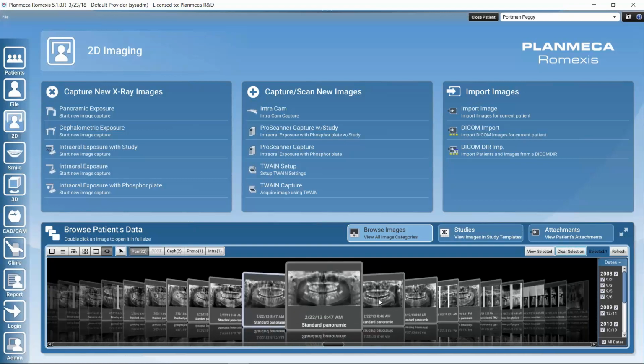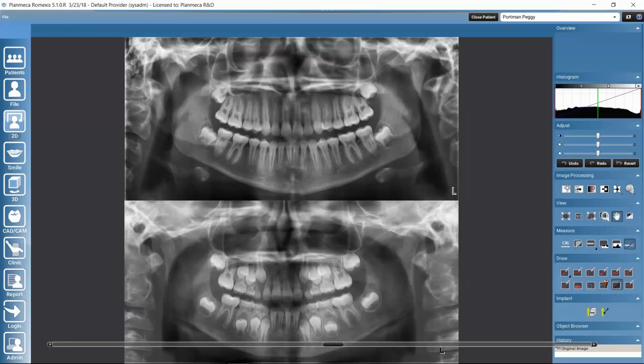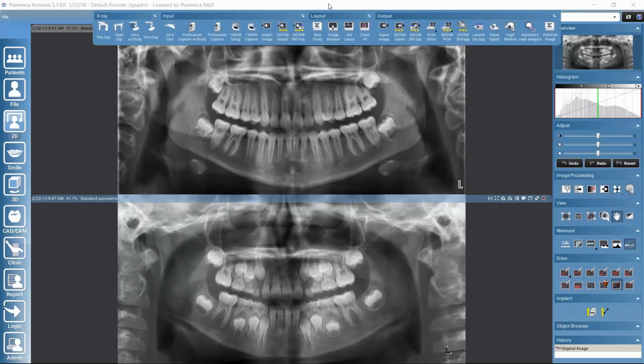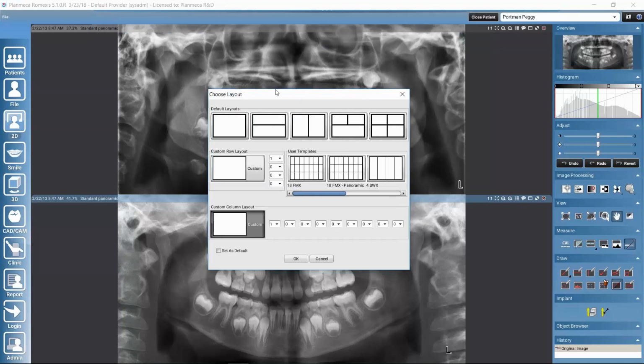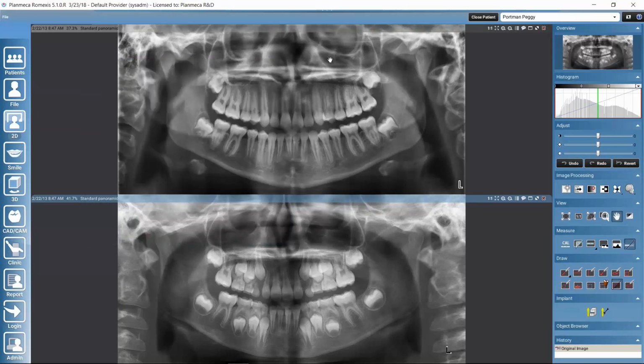So if I select here, for example, 2 images by keeping the control down, I can open 2 images simultaneously. And firstly, like actually shown already in the other tutorial, we could determine the layout for these opened images. So we could determine if they would be next to each other or on top of each other, and so on.